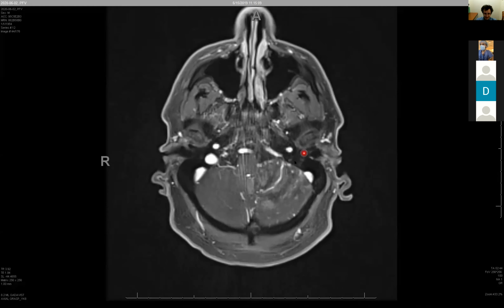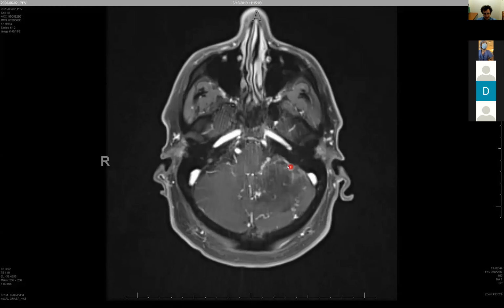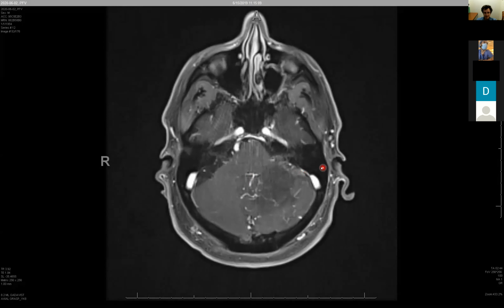Okay, there. So there's that vein, and the connection here is not very robust. Part of the issue probably is that there's not a very ready source of outflow. And that's what distinguishes these things from AVMs, for example.